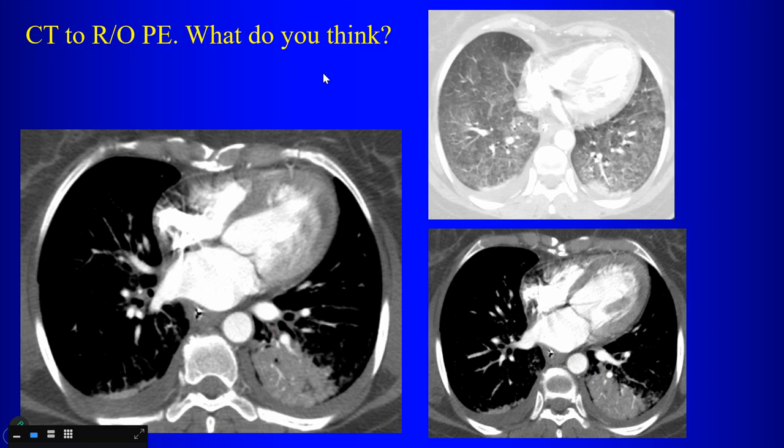There's your CT for a PE scan. What does it show?